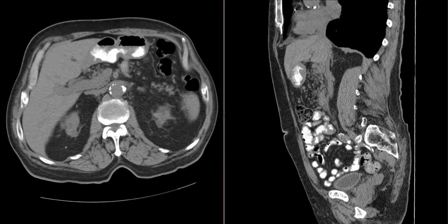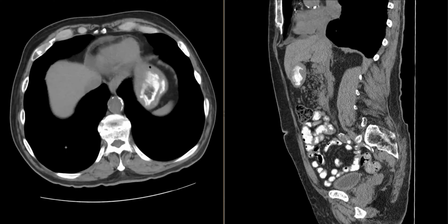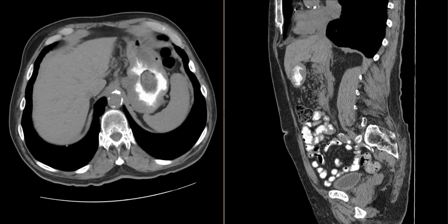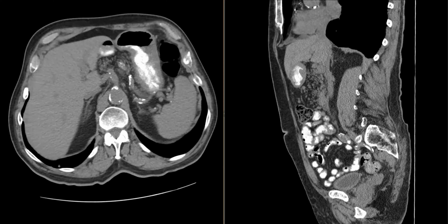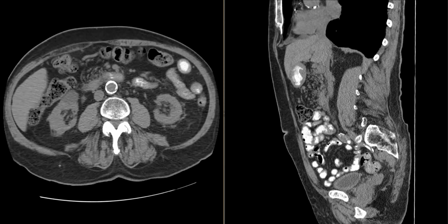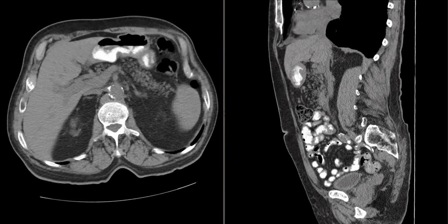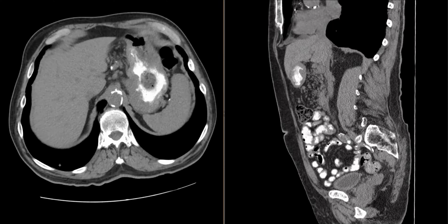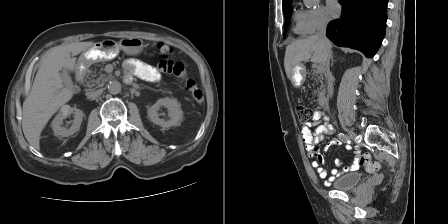All right. So this is a non-contrast CT abdomen pelvis, and the indication is abdominal pain and weight loss in an 82-year-old gentleman. Contrast shortage, so non-contrast, obviously. So we scroll through. I'm just going to stay in the upper abdomen. You can call out anything that you see that just looks suspicious at all. Presumably that's just ingested stuff in the stomach.